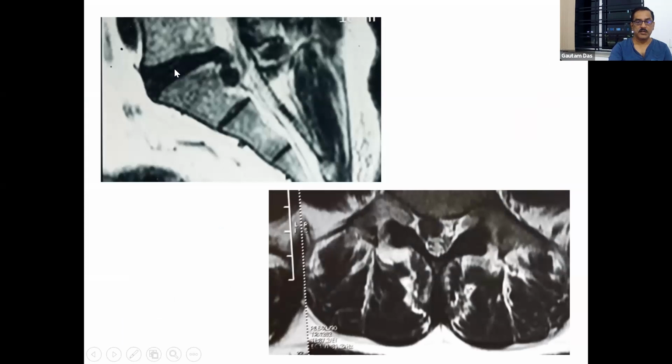So here this is a downward migrated disc. You see this material is coming downwards, and you can see at this section this is again L5S1. So this is the disc material. And how will be the clinical presentations? Here this is the right side. Right-sided S1 radicular pain and radiculopathy will be the clinical presentations. Why is it important? Because MRI might be asymptomatic in around 50% of situations. So unless this MRI is matching with the clinical feature, it doesn't have any importance.